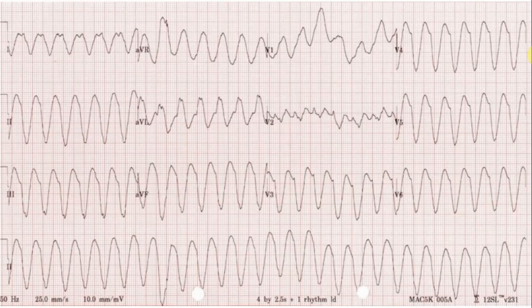As I said, I am unable to see any P wave and PR interval. The QRS complexes are very wide, about 200 milliseconds. The QRS complexes are regular. I am struggling with the ST segments and T waves. I am unable to comment on the QTc either. The aVR lead suggests northwestern axis.